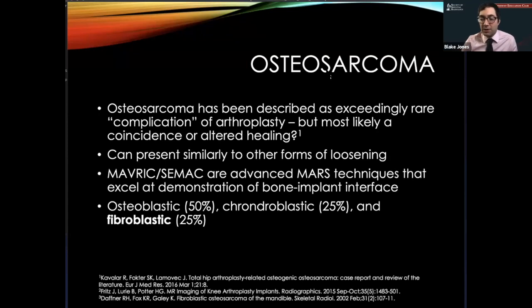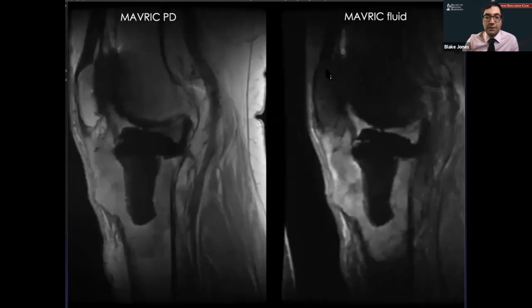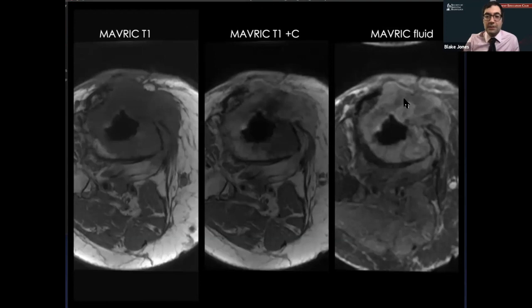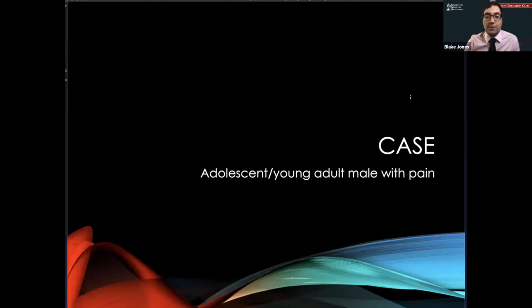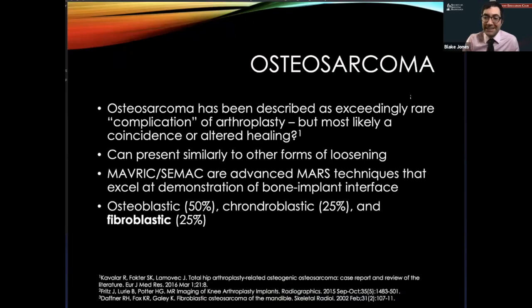And when they did so, as you can see from these axial images here, the lesion was actually exhibiting soft tissue extension, and there are other images that show it better that I don't have here. Basically, the lesion was kind of wrapping around the patellar tendon, and so a resection of this bursa was attempted, and the path was high-grade sarcoma. So that's how we knew in real life.